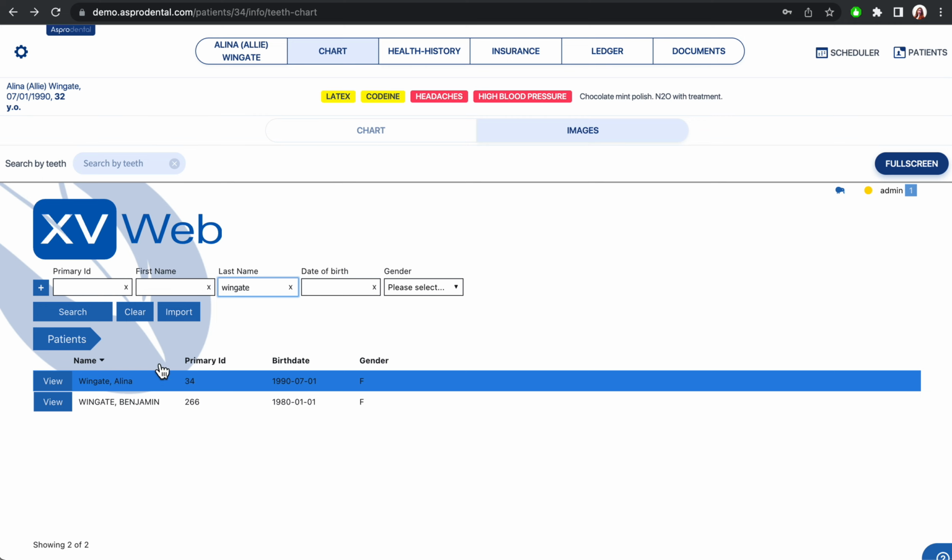And same thing with the name or gender change. It might be because the patient changed their name or had a gender misentry, and so there were x-rays tied to the wrong profile, and when a new one was made, that created 2 different x-ray accounts, and when you're viewing them, you're only viewing one of them.